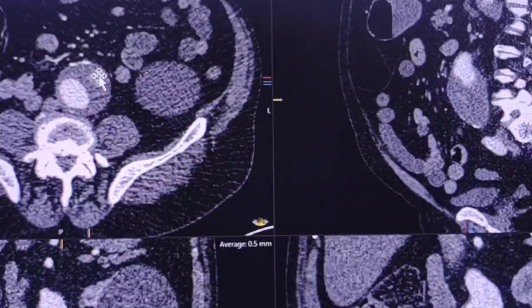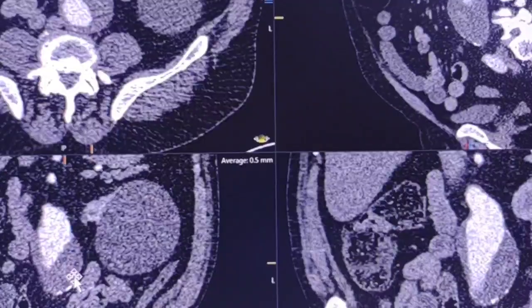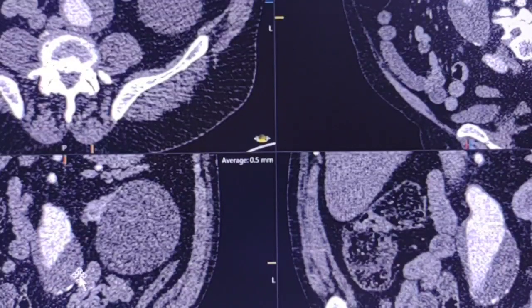It is this slightly wide linear structure in the thrombus, here in the axial views, here in the sagittal views, and here in coronal views. It is very ill-defined, and we must pay attention to identify it, but it is very important.